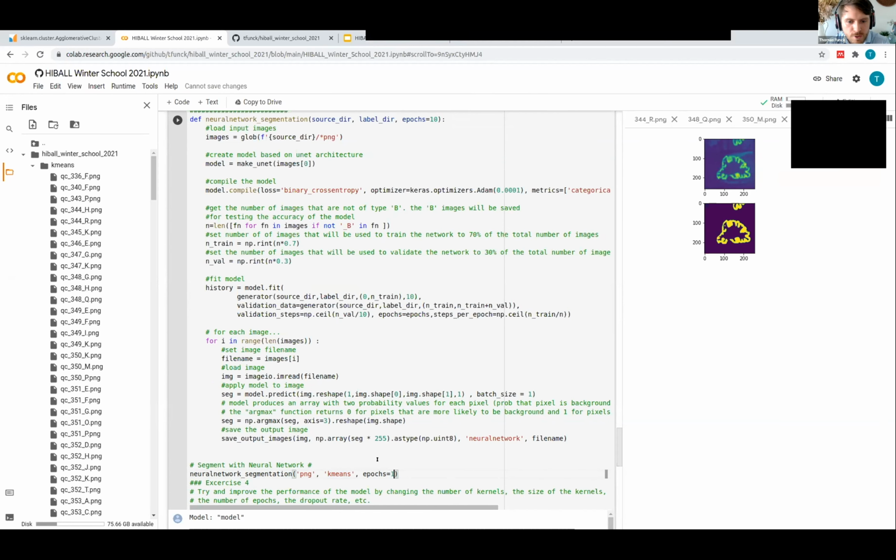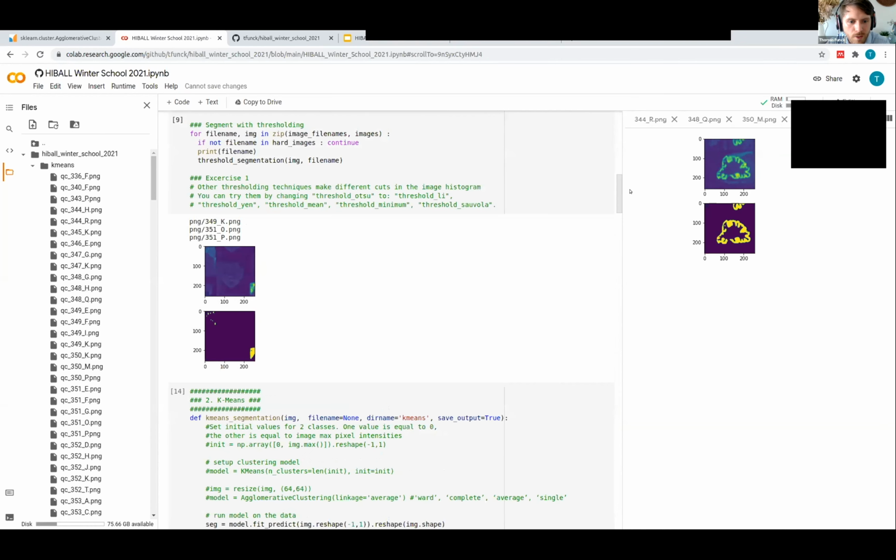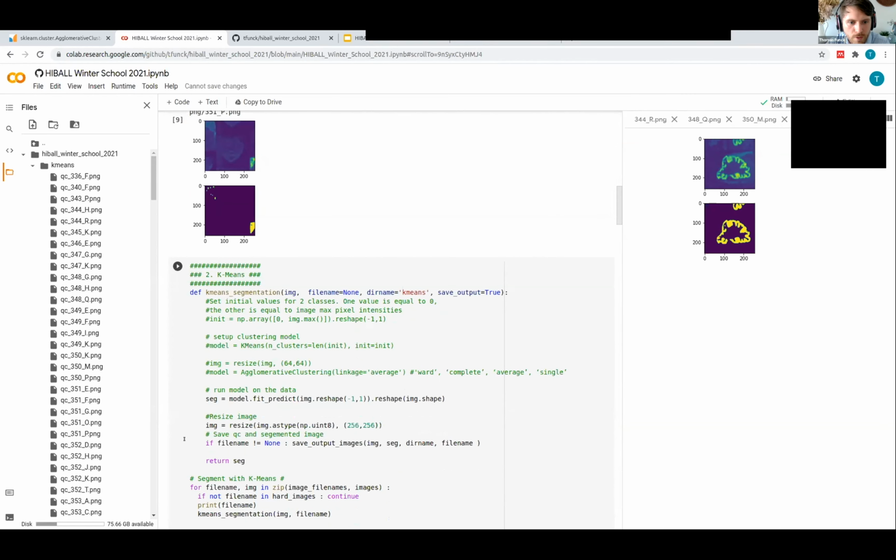And actually, you can use this sort of approach to bootstrap some labels, which I'll explain in a second. So I'm just going to run this quickly. Oh, it's complaining. Okay, so the problem is I need to rerun the k-means because I think I didn't write all of the images that I needed, or they might not have been resized correctly. I'm not sure. But in any case, I'll rerun k-means quickly, and then we can run that.